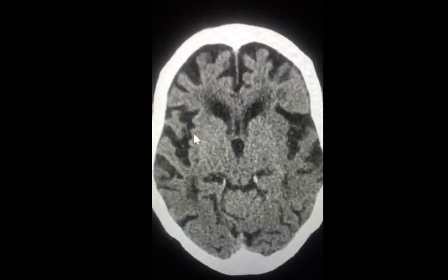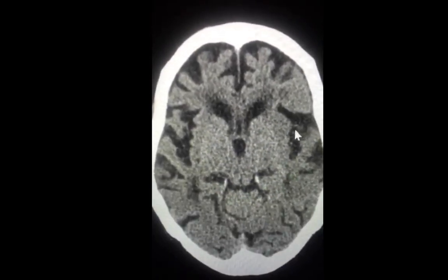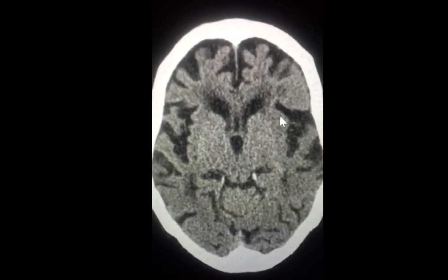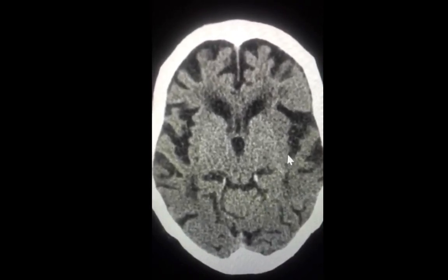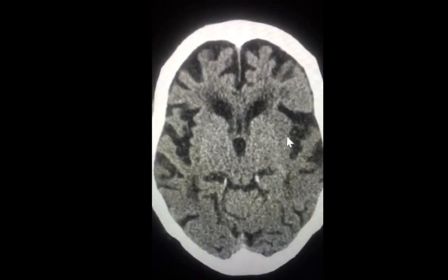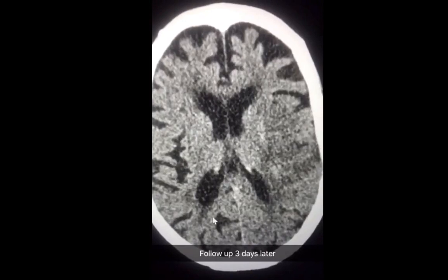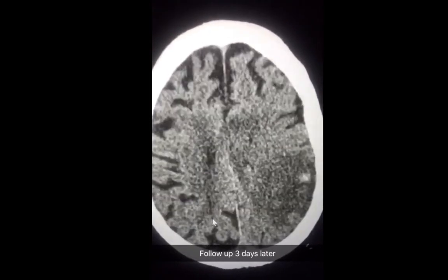Now compare this normal side to the abnormal side. Where you have the early signs of infarct, you lose these sulci. Edema related to infarction in any part of the brain would give you what we call sulcal effacement, a sign of mass effect. We saw the initial CT. This is a CT follow-up performed about 3 days later.